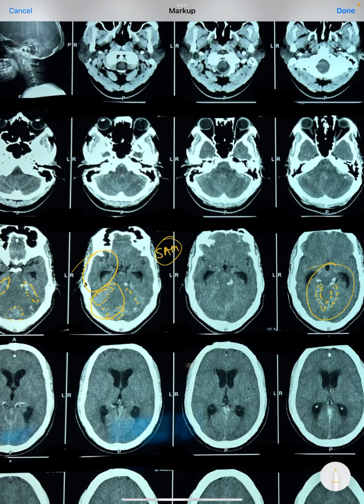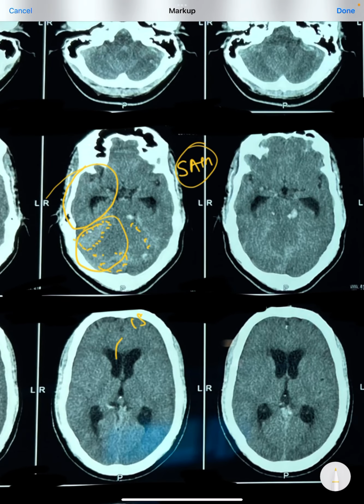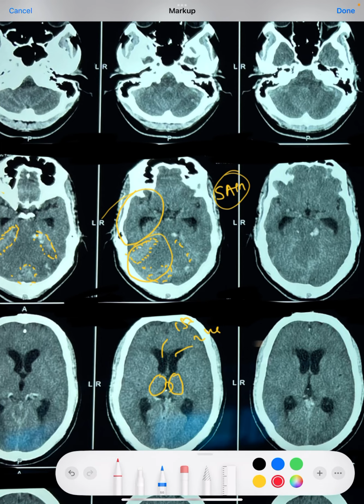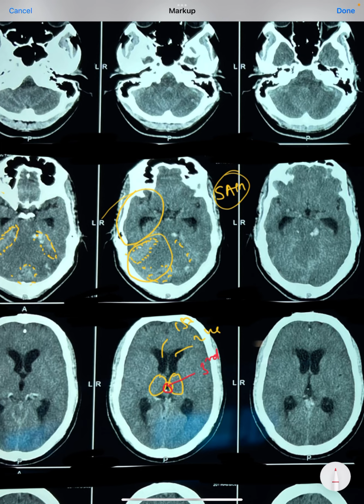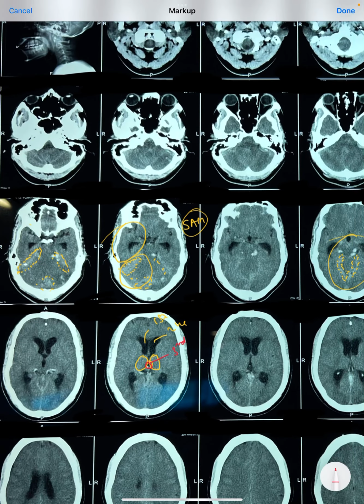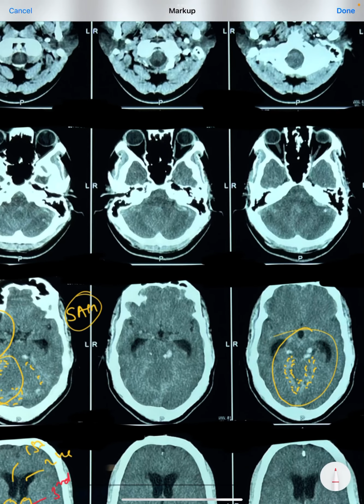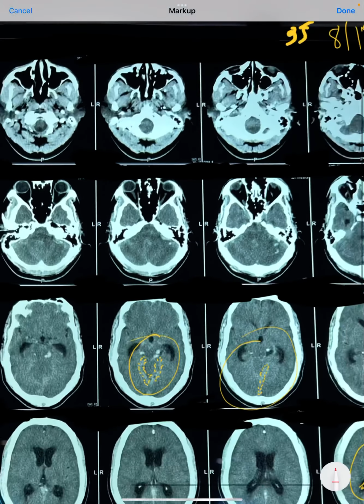The other thing we can see is the first ventricle and the second ventricle. The third ventricle we can find in between the two thalami. So in between the two, what we can see is the third ventricle. So we can see the first ventricle, second ventricle, third ventricle, and this third ventricle then passes toward the spinal cord as the fourth ventricle. We should be able to see this fourth ventricle at the level of the pons, below the level of the pons, but here we are not able to see that.